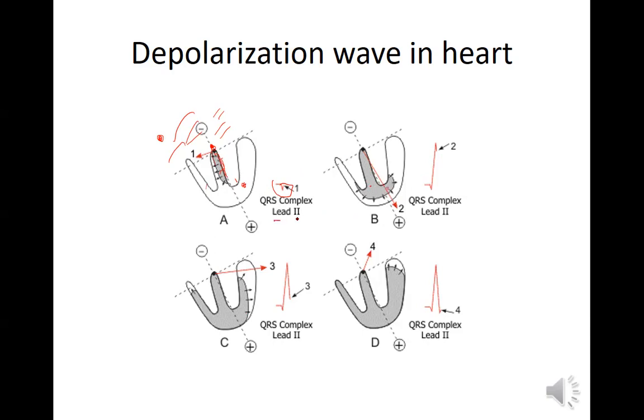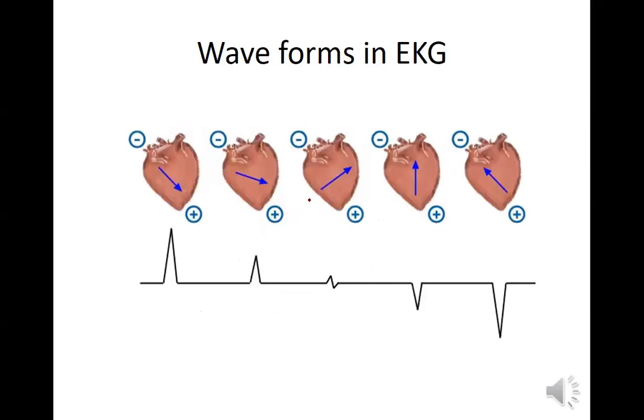Yeah. So then it goes downward, and this is the best part, because now right here, lead 2, and this is all lead 2, by the way. So that's where you get that nice upright R wave that starts to go downward as the depolarization goes upward and outward, endocardium to the epicardium, and then goes upward because the blood pumps up, right? We want the muscles to contract after depolarizing upward. And you get that little S wave, which is bigger than the Q wave. Both Q and S are negative waves.